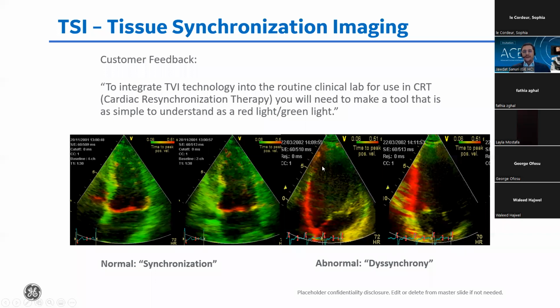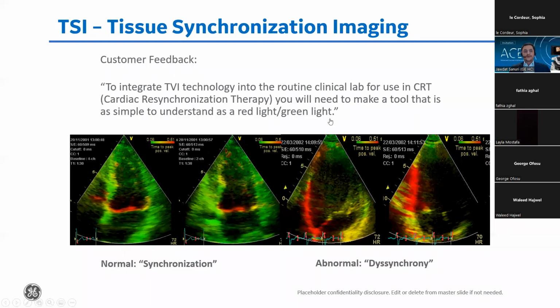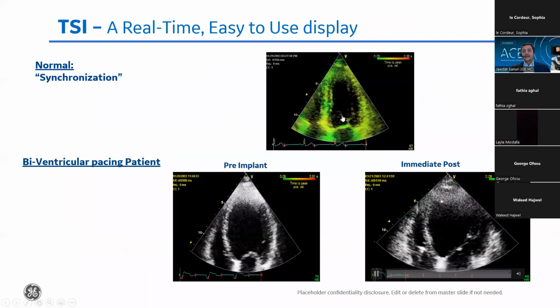So if the velocity curves have different times to peak velocity, you will find different phases for them. So if you have these typical normal peak velocities with a huge difference in phase, and also normal strain but a huge difference in phase, that's usually a suggestion that this could be a good candidate for a pacemaker, of course.